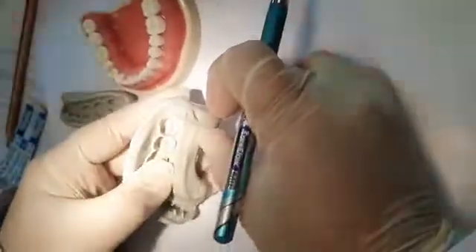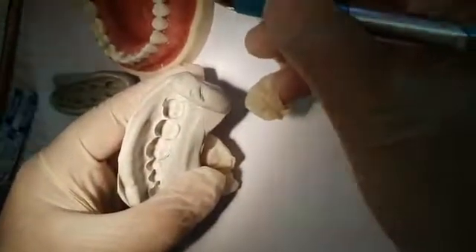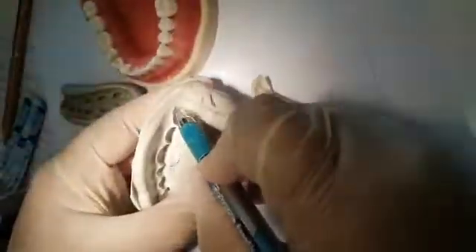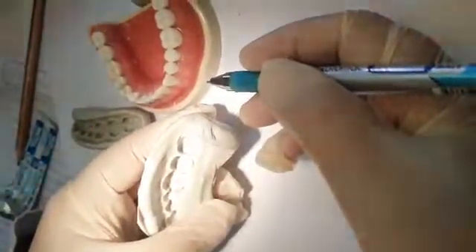I wanted to show you them and what will happen if it's a crown. You will not take the finish line correctly. If it was temporary, you will spend a lot of time removing this excess material. So make the correct impression rather than correcting the procedure later on.